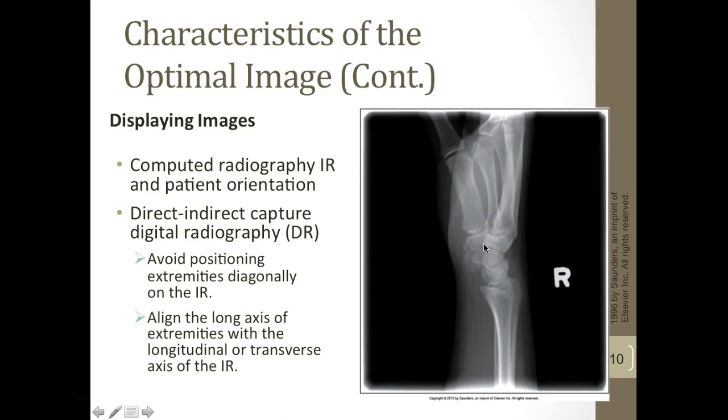The one thing I see about this particular wrist that they're shooting is that the marker is on the lateral side, which is great, but their collimation is huge. So you need to bring the collimation in nice and tight. I usually take it just outside of the widest soft tissue margin. So we're going to learn further exactly where you're supposed to have that collimated field.